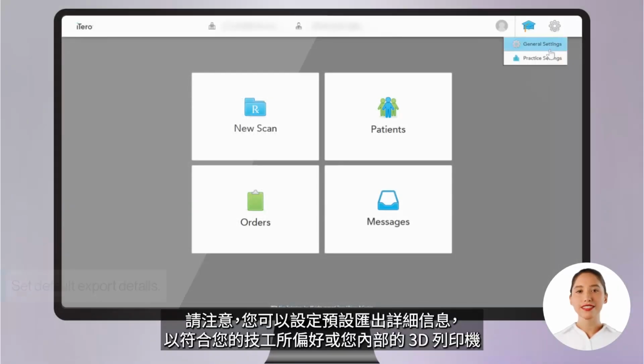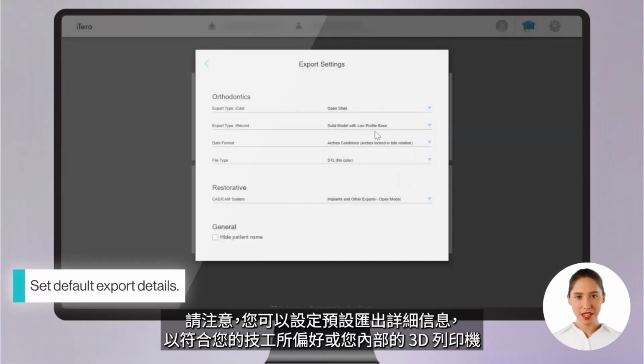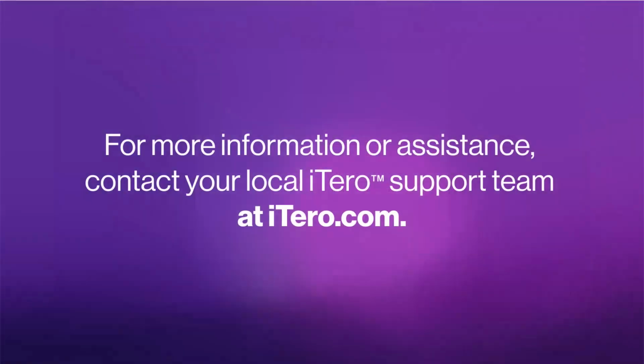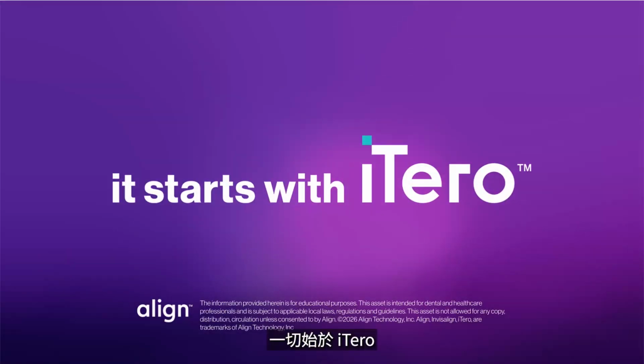Note that you can set default export details to match your lab preferences or your in-house 3D printer. For more information or assistance, contact your local iTero support team at iTero.com. It starts with iTero.